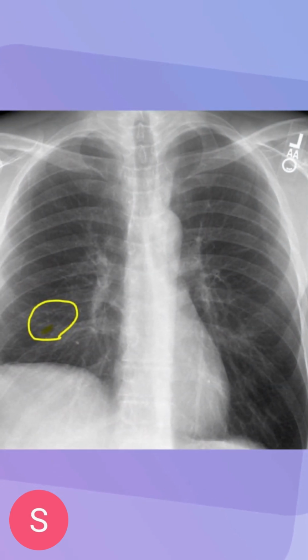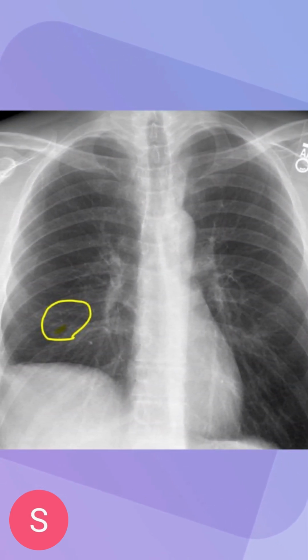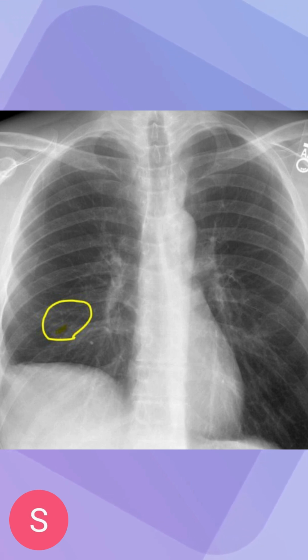Now, here's another example, a much harder example. It gives you insight into how closely and how keen radiologists have to be when they look at these imaging softwares. Obviously, they have zoom tools and different clarifications that allow them to identify them more quickly and easily than us.